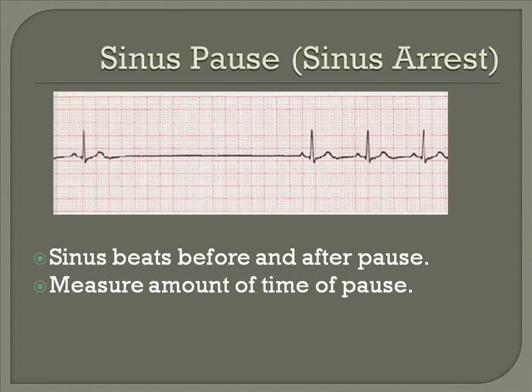This is something known as a sinus pause. As you can see beforehand, there was a sinus beat, so we know this person is having a sinus rhythm of some sort going on. And afterwards, there happens to be a sinus beat. The sinus node just seemed to have taken a break for about 3 seconds in the middle there. So you know it's a sinus pause because you have sinus beats leading into it.